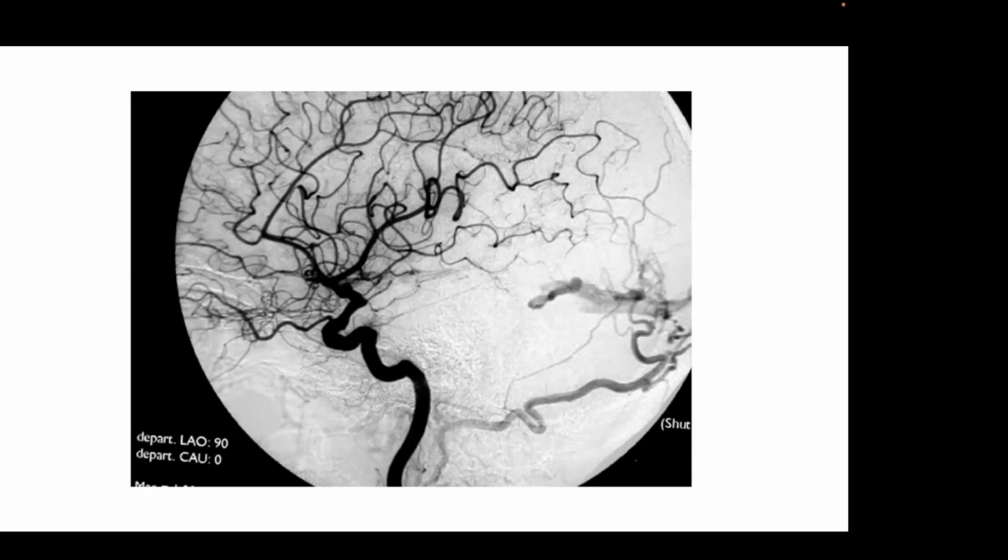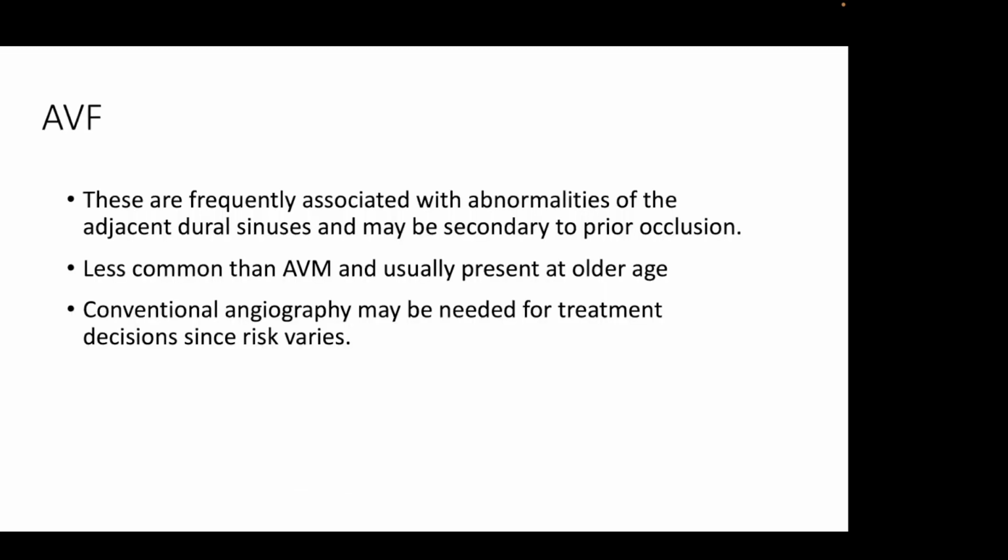So again, arteriovenous malformations are supplied by the pial branches. These are the intradural, sort of the posterior circulation. The dural fistulas are supplied by the external branches, in this case, the occipital branch. I guess we have a little time, I want to maybe just show a couple cases. Maybe you can help me with some of these cases.